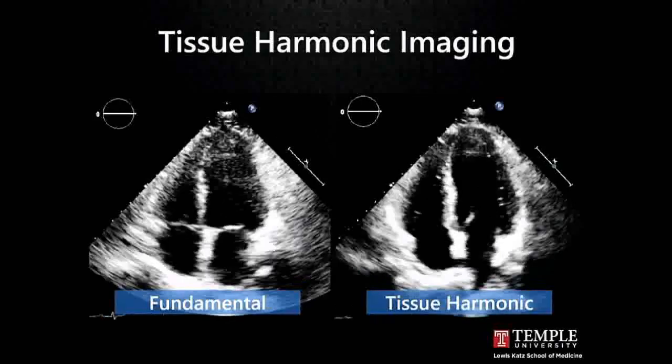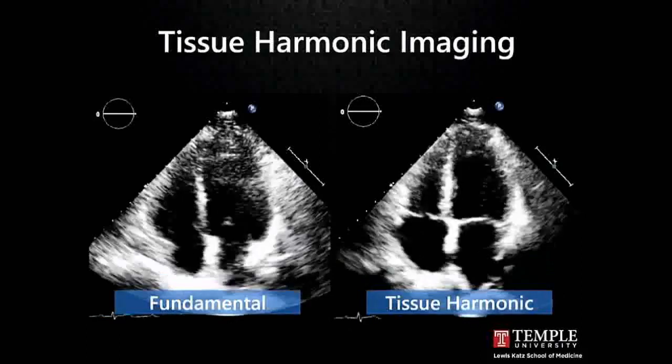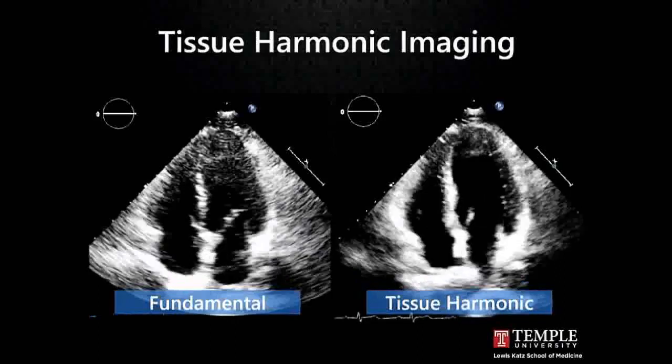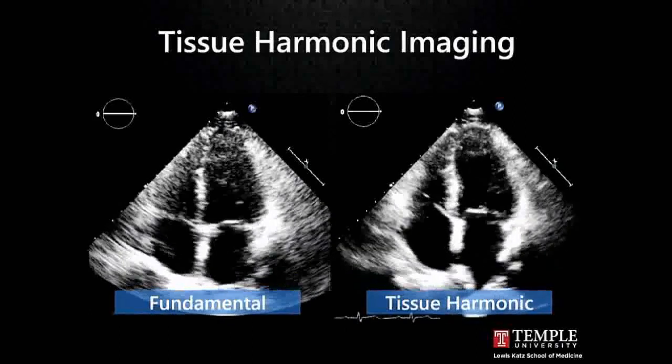So you'll notice, as you do clinical imaging, that tissue harmonics makes things look thick. Remember that mitral valve that's thick, but it's not thick? You remember the aortic leaflets that just don't seem quite normal? Think back, maybe it's tissue harmonic imaging that you're perceiving, and there is actually no pathology present.